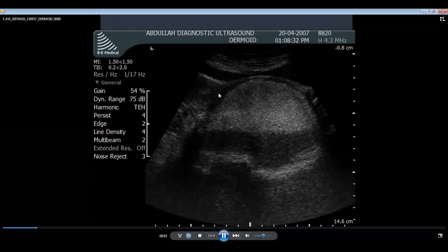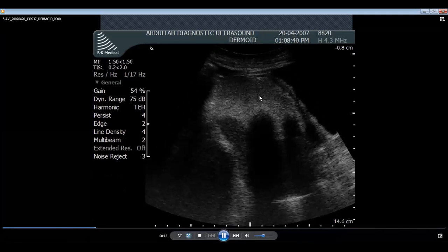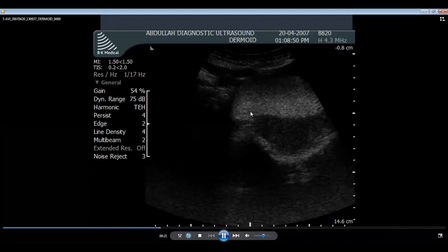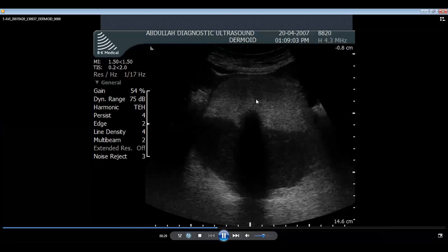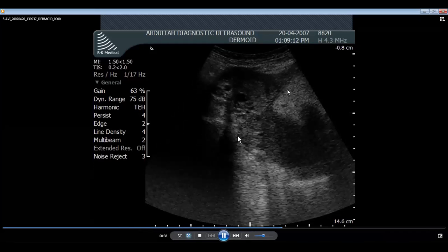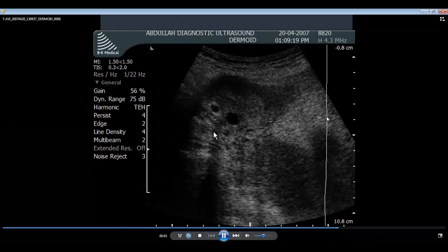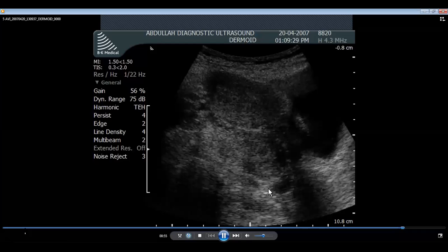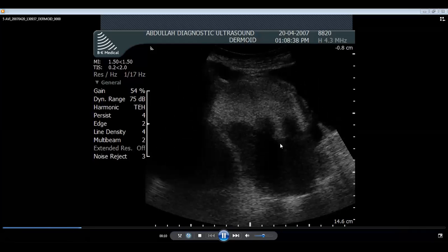How is a dermoid different from other ovarian cysts? We will find in a dermoid sebaceous material floating in the cystic medium. So this is how we say that a dermoid will give us a paradoxical appearance, against truth. It is not a truthful appearance, that solid, which should normally settle down on the posterior wall, is floating on top of the cystic fluid. So this is the paradoxical appearance of a dermoid ovarian cyst, in which you will see the sebaceous material, the fat, floating on top of the cystic fluid.